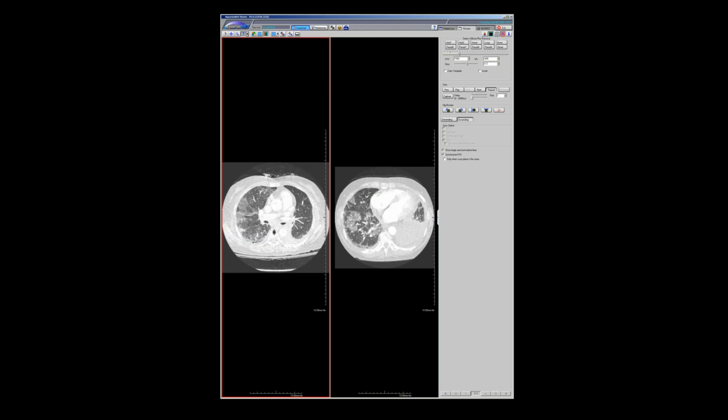I don't know. This one was just very odd to me. It was almost a photo negative of one versus the other. You can see here where it was spared, and now the area around it is involved. Can anyone explain? I was trying to think of 2 different instances of lung injury, where the first one was somehow protective or limited the injury of the second, because of, I don't know.